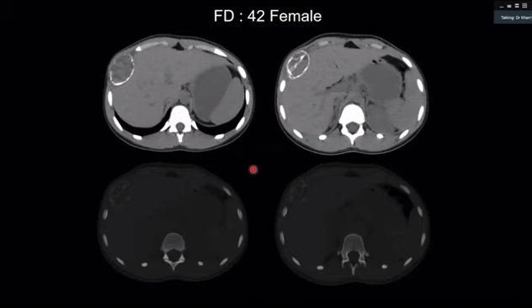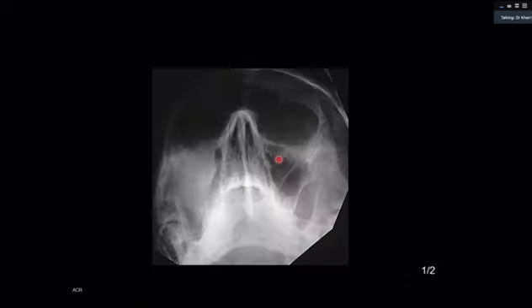But go back to the basics, and please remember that fibrous dysplasia can have cysts, and it can be lucent also. So I'm not saying that you can diagnose it, but with this kind of case, the examiner is going to ask your thinking, and the examiner knows that you might not be able to diagnose it. At least you can think aloud and tell them what you are thinking. Yes, please.